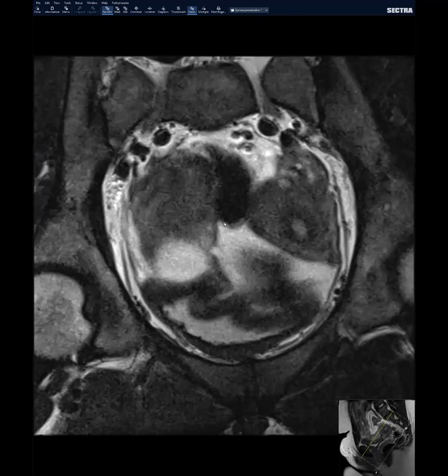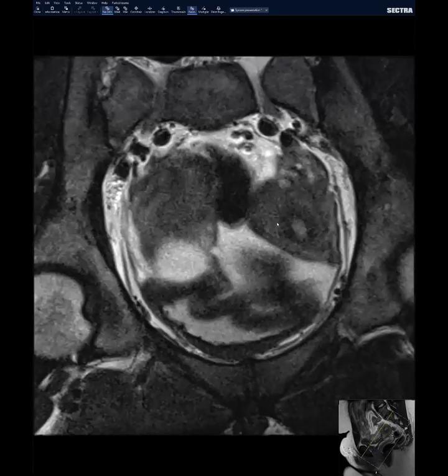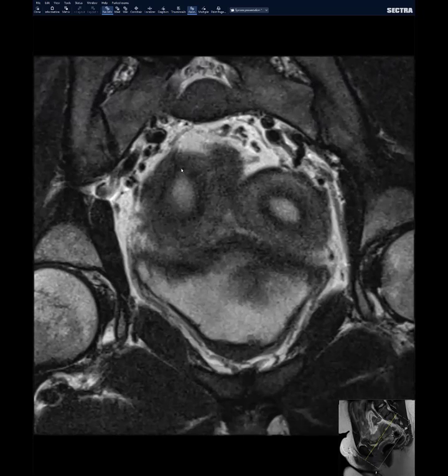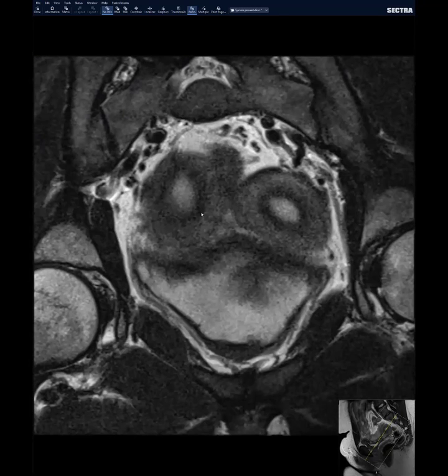So it's a unicornuate uterus, and we see another uterine cavity here, but there is no communication of this with the main uterine cavity. So this is the unicornuate uterus with a non-communicating rudimentary horn. An important thing in these cases is to tell if this rudimentary horn has functioning endometrium or not, because that has important clinical implications. In this case, the functioning endometrium is there, and its presence results in fertility issues and a lot of pregnancy related complications. So it's important to mention that part, because this rudimentary horn may or may not have functioning endometrial tissue.